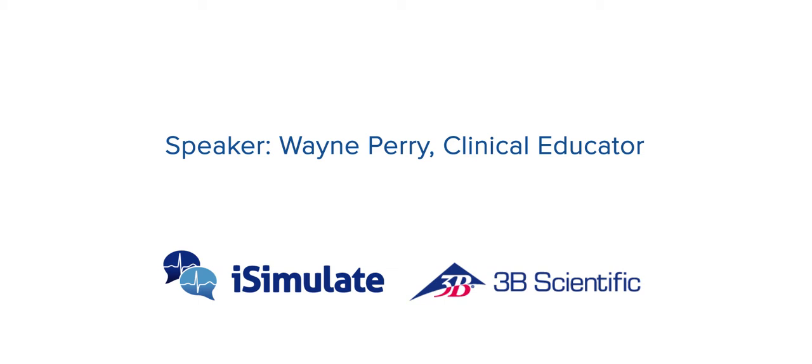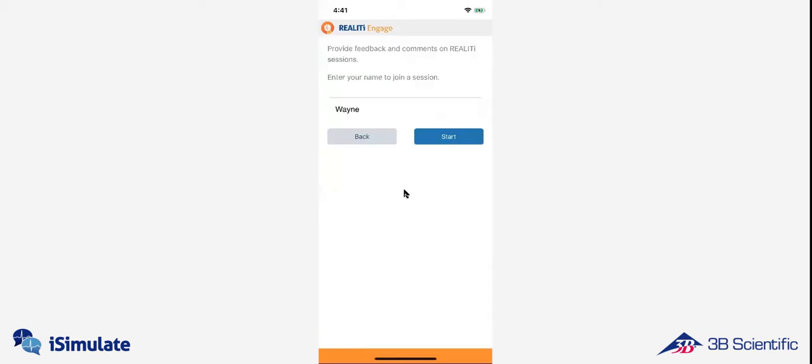So I'll share the app for the Engage on the screen so you can see it. When you open the app, this is what the screen will look like, and it's going to ask you to connect. Both of the devices have to be on the same Wi-Fi, so whatever monitor and control system you're using for the REALITi and the phone that has the Engage app have to be on the same Wi-Fi system.